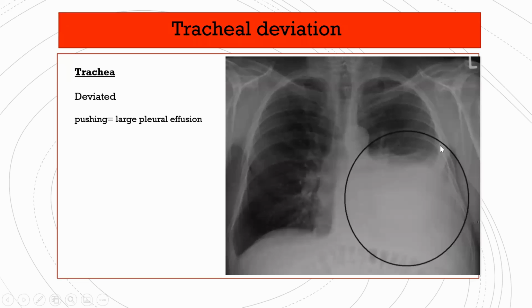Right, so remember this sort of image in your head, you see? It's completely white out. It can't be a pneumonia that's that big, okay? It has to be a pleural effusion. It starts from the bottom, fills up.